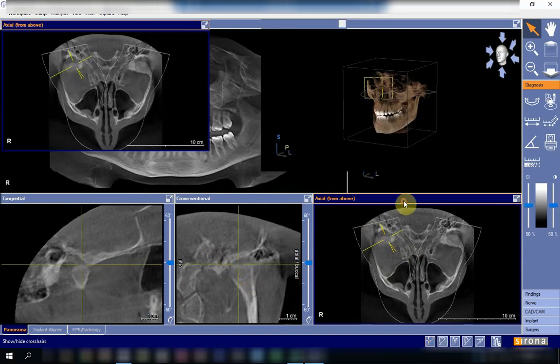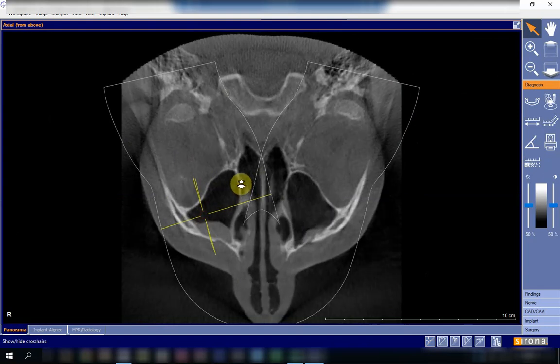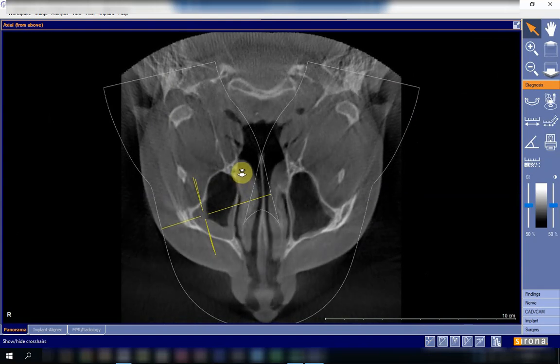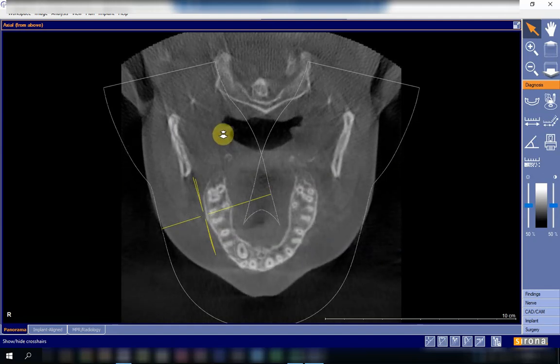And then I will try to move in a downward direction. See, I'm moving down, down, down. What I'm seeing here is actually the condyle from the top in a superior inferior direction. Now the condyle here is over. I started with the condyle, I'm looking here, by the way, and then I will end up with the ramus of the mandible.